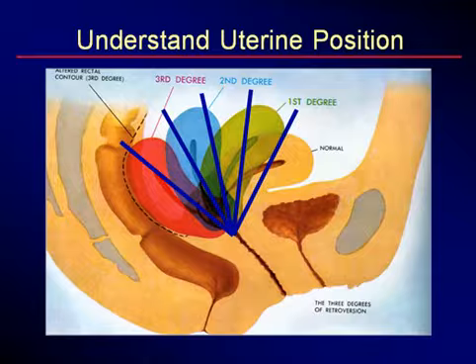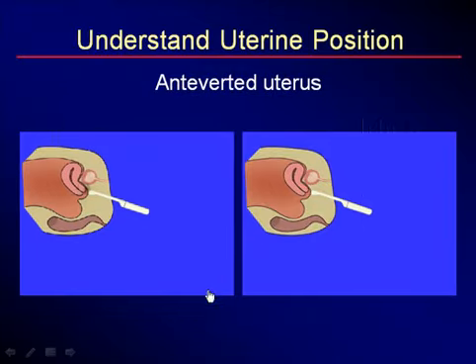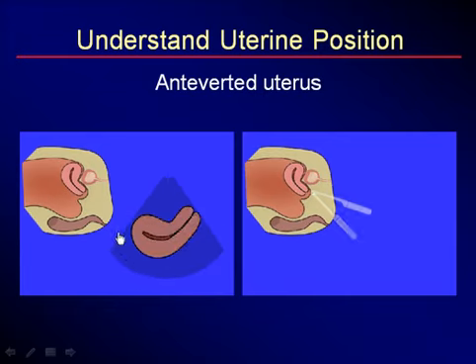The uterus can be anteverted, usually. It could be in the mid portion of the pelvis, or it could be retroverted. And we have to understand the position so we can place masses correctly, place fibroids correctly in such a plane. So here's the standard view. This is sagittal. This is anterior, so this is the anterior wall, rotated 90 degrees.